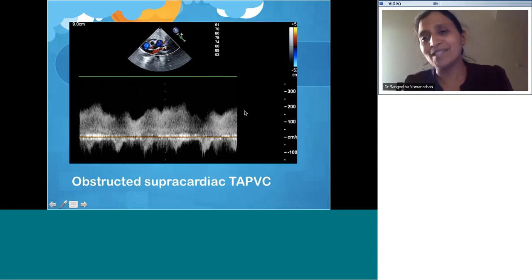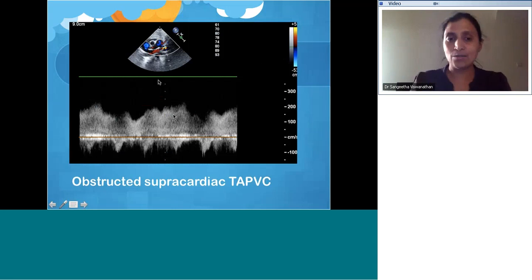Right, hemodynamic wise. Yes, exactly. So it should touch the baseline. So you see, it doesn't touch the baseline. That is a characteristic of obstruction.